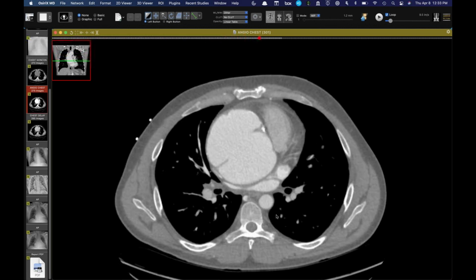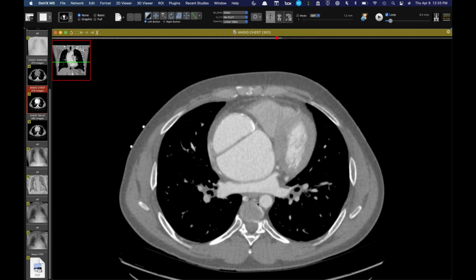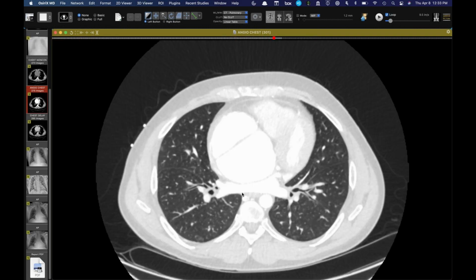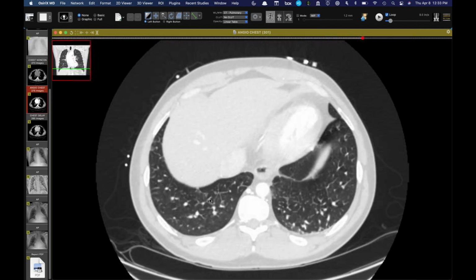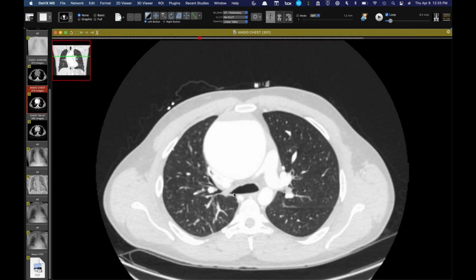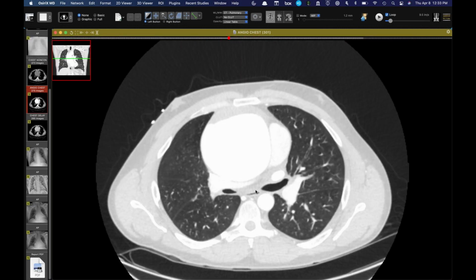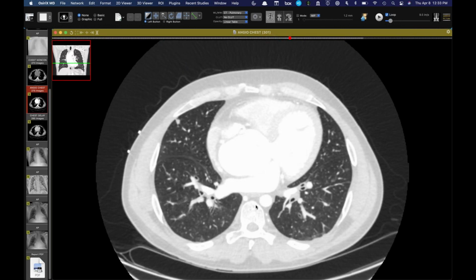But that is a big one, man. Yeah, I know. The degree of mass effect on his left atrium, surprisingly, he's got a tiny bit of pulmonary edema, maybe from chronic venous pressure increase from that mass effect, but it's compressing the pulmonary arteries as well. So does he have a bicuspid valve by any chance?